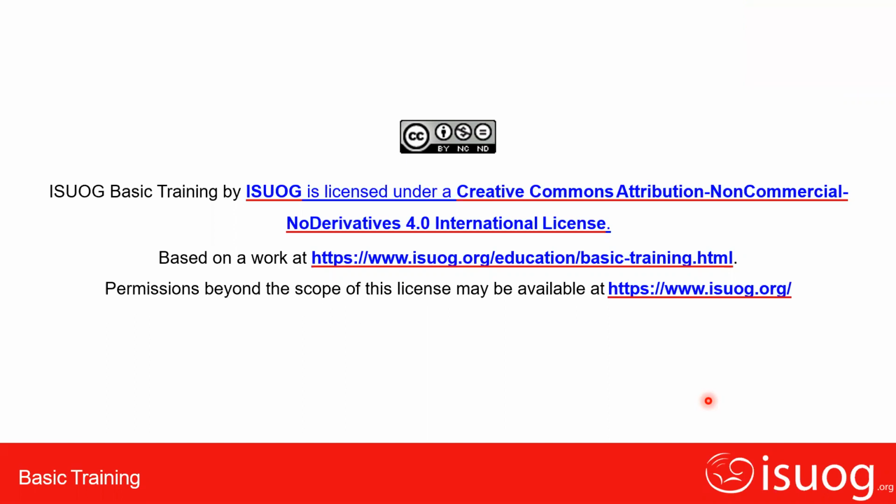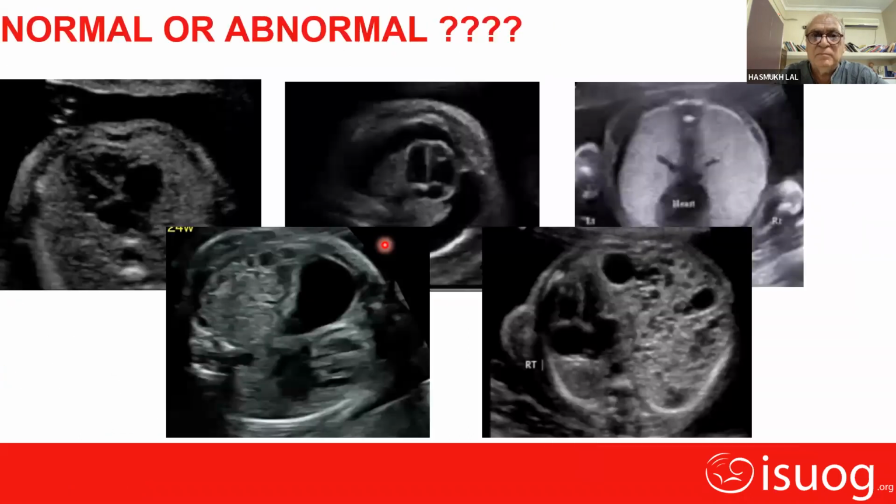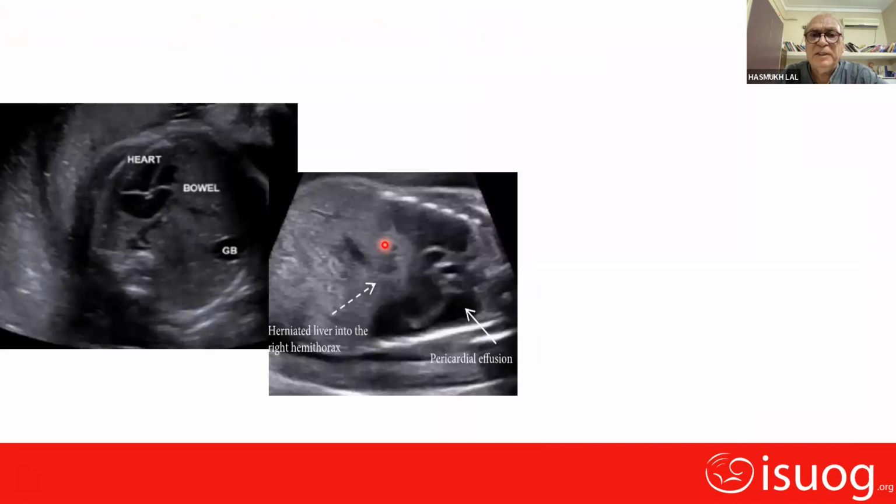Dr. Padmalochan Mahanta has requested a review of the esophagus slide. Okay, Rama, can you come back to your slide again? Please have a view of the esophagus again.